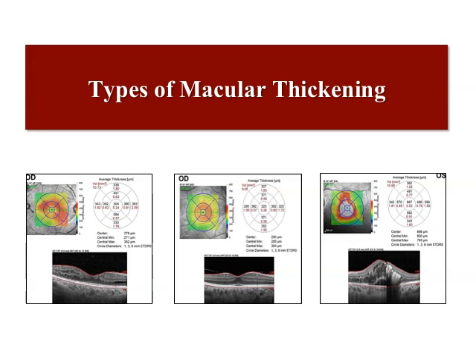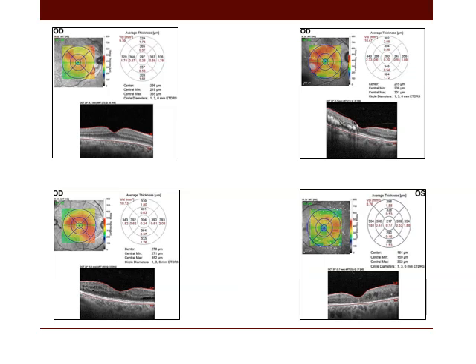We have types of macular thickening, which are the diffuse spongy thickening, the focal spongy thickening, and cystic thickening with serous retinal detachment. We can divide the diffuse or small cystic thickening into 2 important types: central involving and central sparing. As we all know, central involving thickening indicates the patient needs treatment, while in central sparing treatment can be halted or you can try laser photocoagulation if you wish. However, no need for injection in central sparing.